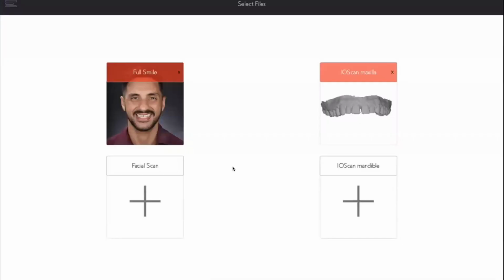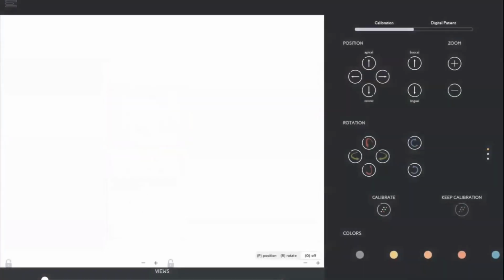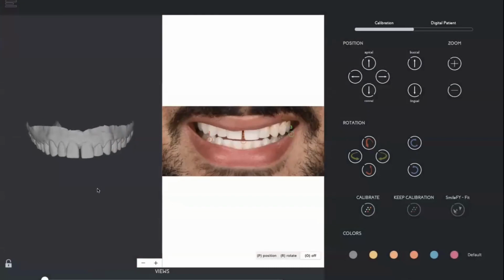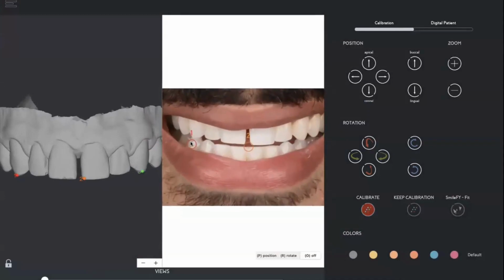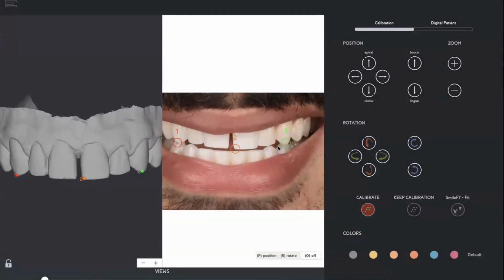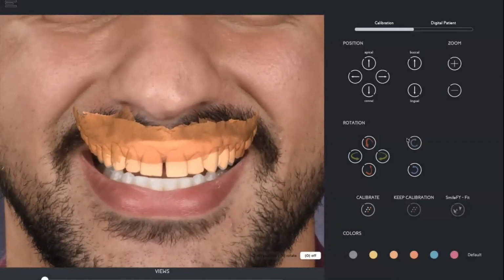First of all, we do have the picture and the intraoral scan. If you do have an intraoral scan with colors and OBJ, then you can use the OBJ with colors, and then you have a beautiful visualization of the upper jaw. We do have the first step, and the first step is manually done. 3 points on the intraoral scan, 3 points on the picture. I don't have the time and the resources to optimize and automate this step right now. So we're going to work on it at a later point, so that we can finalize what is actually way more important.